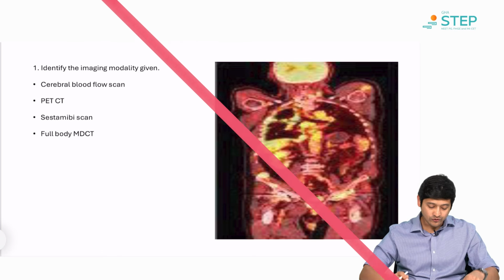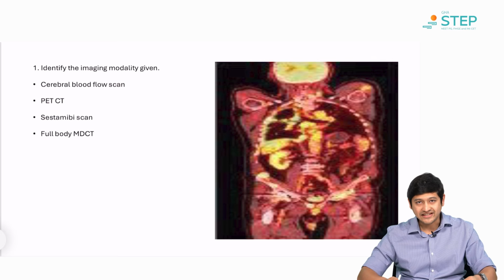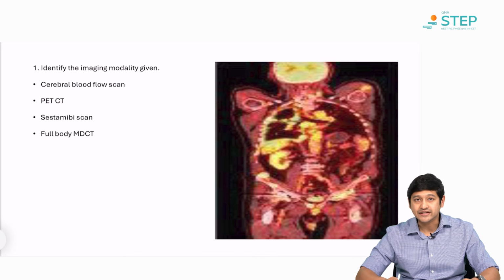First off, you've been asked to identify the imaging modality given to you. Is this a cerebral blood flow scan, a PET CT or positron emission tomography CT, a sestamibi scan, or a full body MD-CT? So to understand this, we'll go over the options.